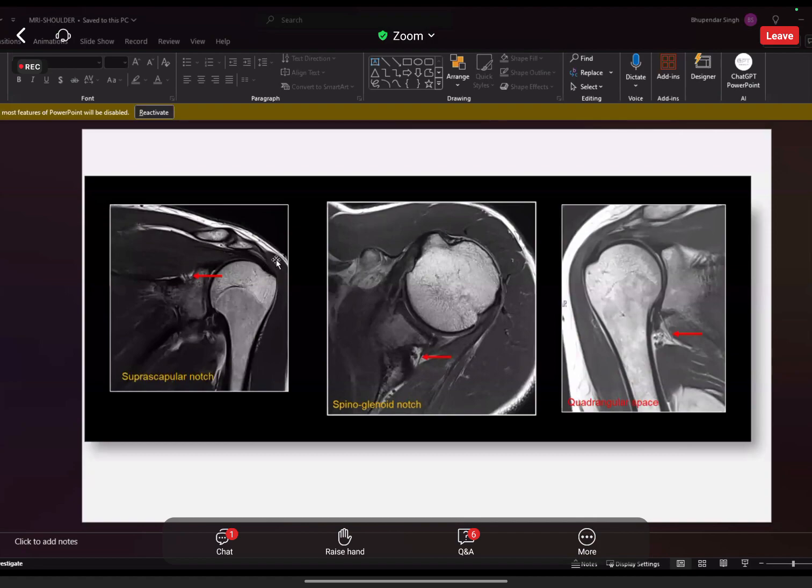Sometimes it can be anterior or lateral downsloping also. Whenever you see downsloping with effacement of the fat pad, indenting the tendon, and any bursitis in that region, that is when lateral downsloping is important. Exact criteria, I'm not sure, and I'm not sure what exactly he wants to ask.